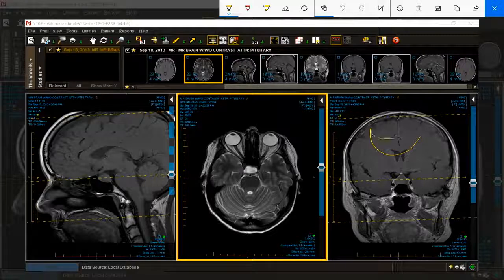Now, here's your sella. And here is your pituitary stalk. It may thicken up a little higher. And then you get inside the pituitary, and the portal plexus comes right down the middle. It should not be displaced to either side. If it is, that is often a sign of an occult pituitary microadenoma. And many microadenomas are not visible. They are diagnosed by laboratory method, by seeing a prolactin level of somewhere around 50 to 100.